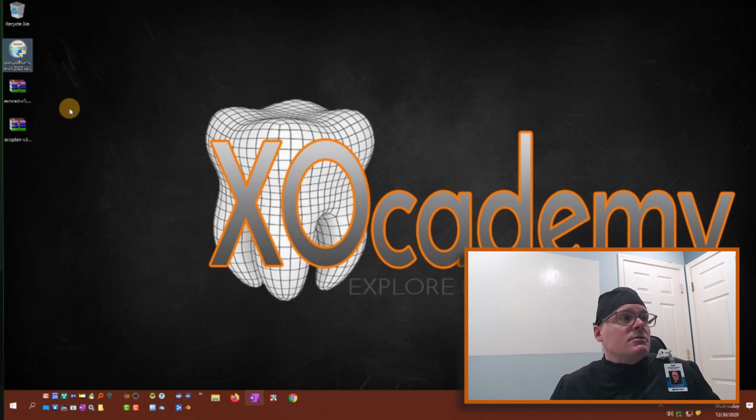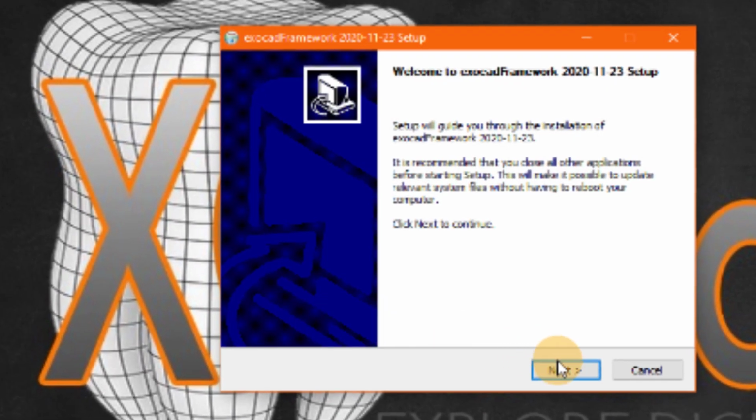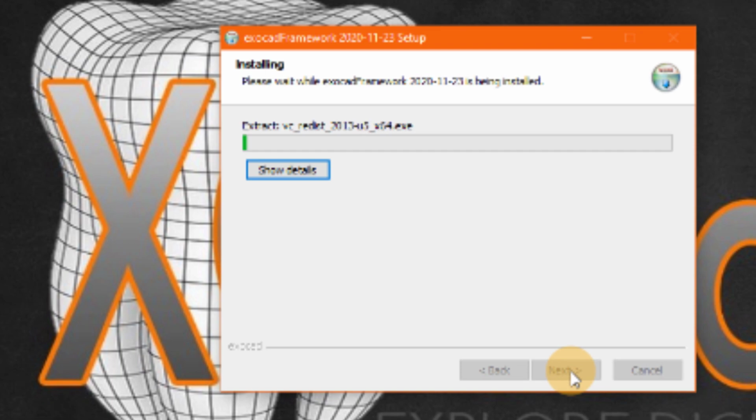So we've downloaded those 3 files. The first thing we're going to do is execute the exocad framework 2020 file. So I'm going to start that, and I'm just going to install it, and we're just going to wait for that to install. That's step 1.